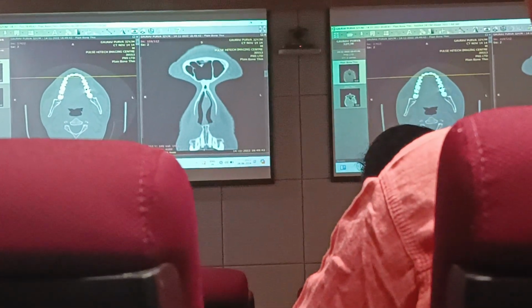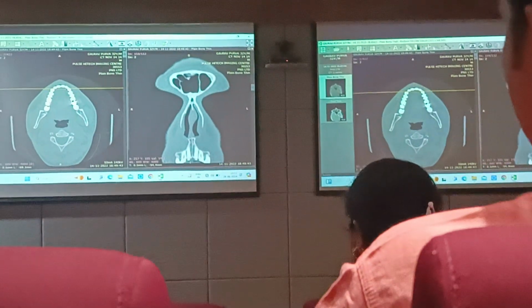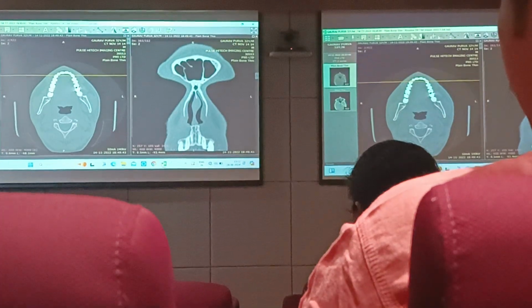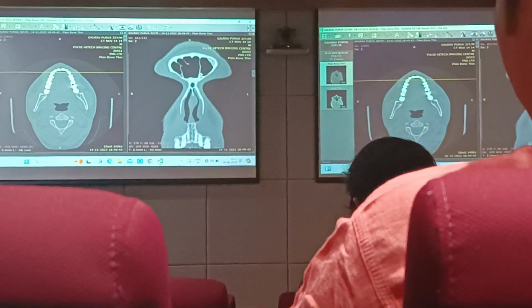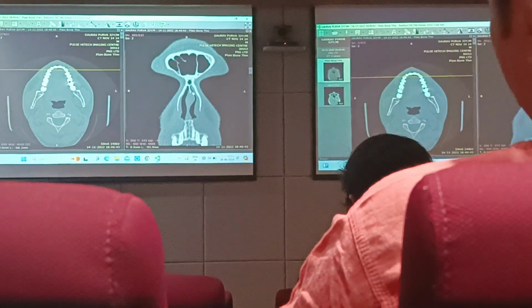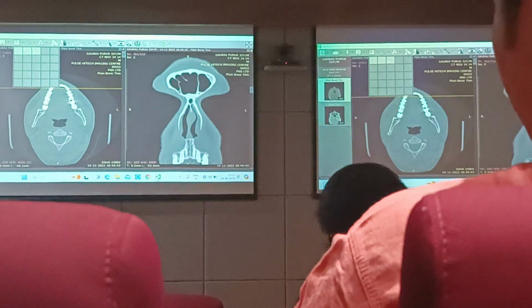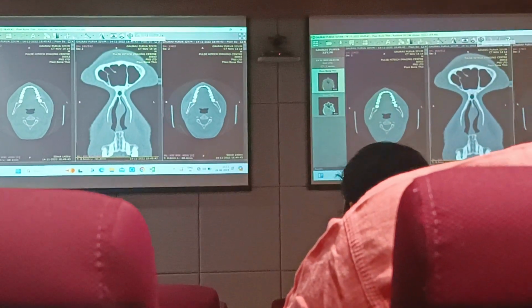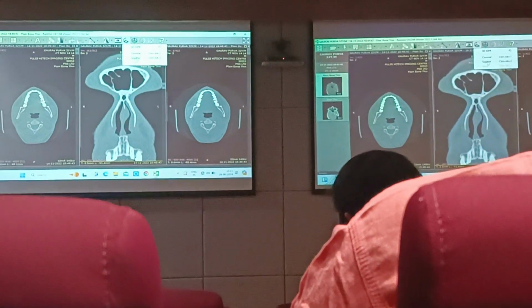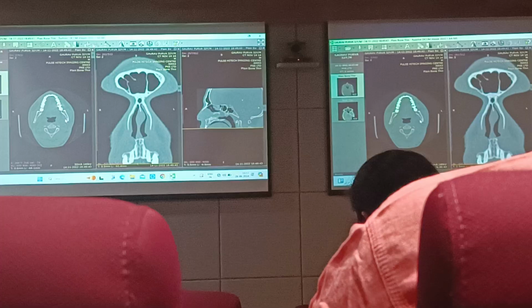What is this over here? Frontal view, in the middle section. Next, what are all these now? Septations. This is the perpendicular plate of the ethmoid, right? Now here, let me also give you, if possible, sagittal. Can you see this now?